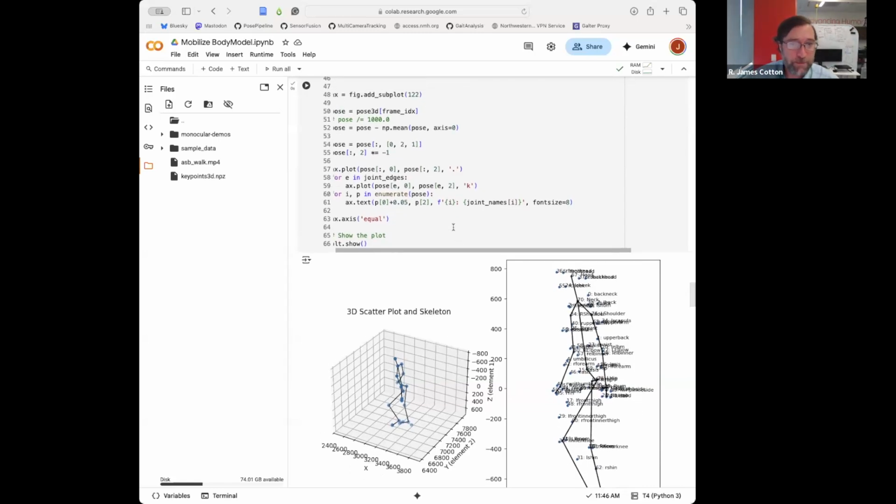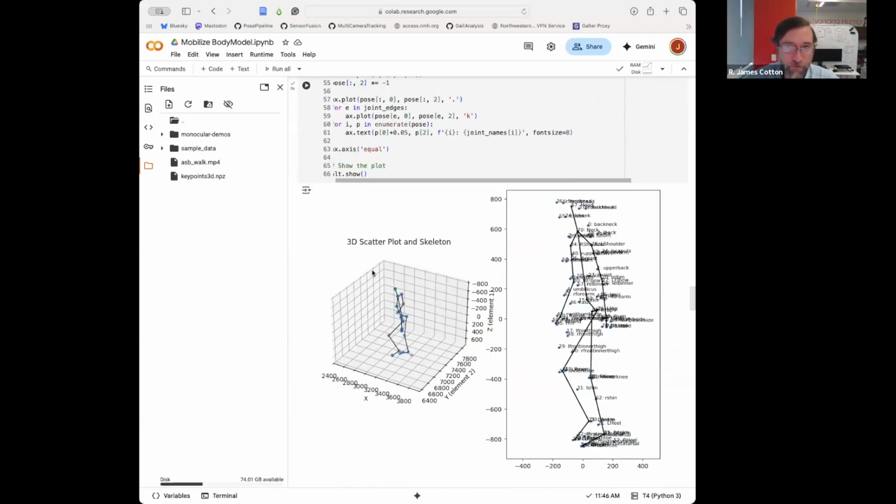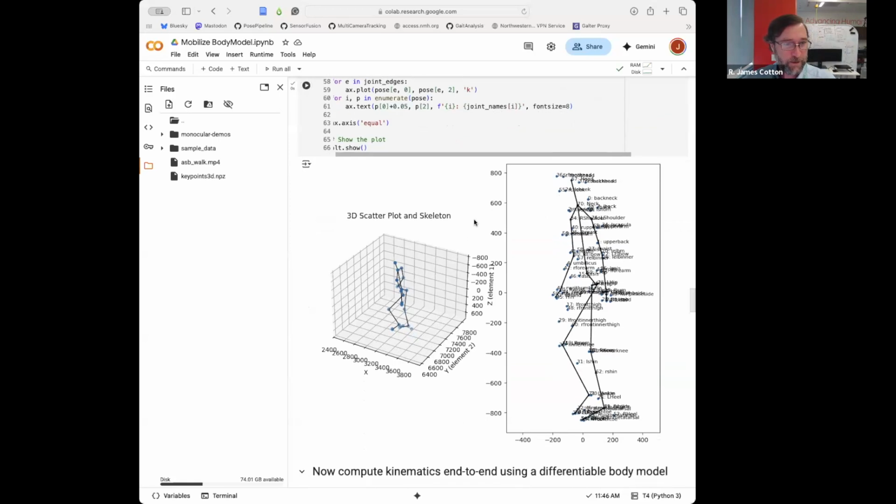Okay, so I'm jumping back over into the notebook now. And what you should see, hopefully, is something like this. I don't know if anyone following along wants to give me any sign that people are keeping up.